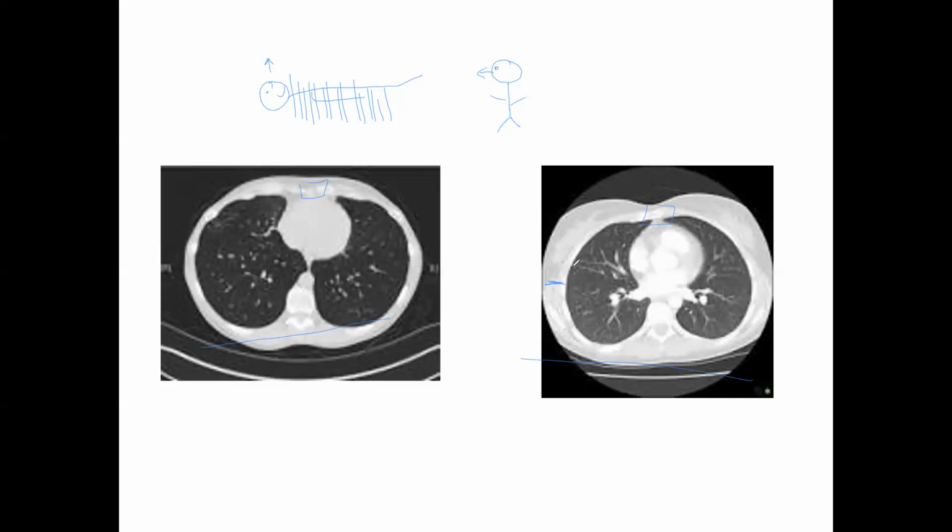So if you assume that both of these patients have relatively healthy lungs, you probably have a little bit better compliance. And compliance is the ability of the lung to receive volume. So you've got a little bit better compliance over here than you might over here, simply because the weight of the thorax is going to press down and ultimately decrease lung compliance. Although for this patient, this may be normal for them. If you're looking at straight up measurements of lung compliance, this chest wall is going to push in on that chest, which would be a force opposing ventilation. So let's go ahead and clear that and move on to the next one.